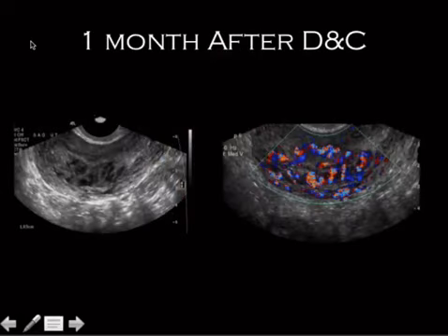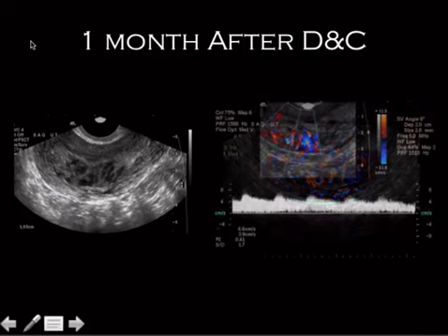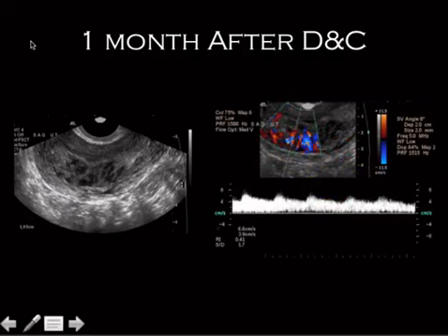All right, so how about this? Anytime you throw on Doppler on stuff in the endometrium, myometrium, this is something that you need to have in your mind, especially if you see something like that. If they throw Doppler, that's actually generating a waveform anywhere that's a solid organ, you should be thinking about some kind of fistula or AVM.